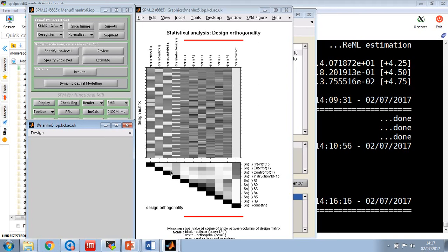Okay, so that makes sense. However, what's more interesting is about motion. So these parameters from here are motion. Motion parameters are correlated quite a lot with each other, and that's not surprising because obviously, as I said before, your head's attached to your neck. So if you move to the left, you also roll your head a little bit. And also people rarely do pure translation in one axis. We tend to move our heads a bit forward and to the left or whatever.